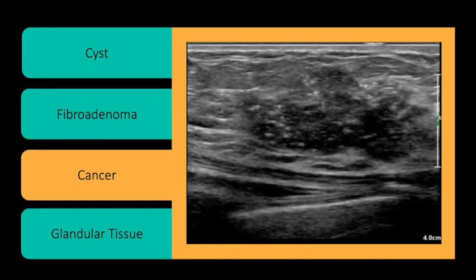Breast carcinomas, on the other hand, are very variable in presentation, but findings that would be typical for cancer include an irregular shape, just like we see on this lesion here, with angled or blurry borders. They're often oriented more vertically in the breast, so they're tall, not necessarily wide, although in this case this one looks wider than it is tall.